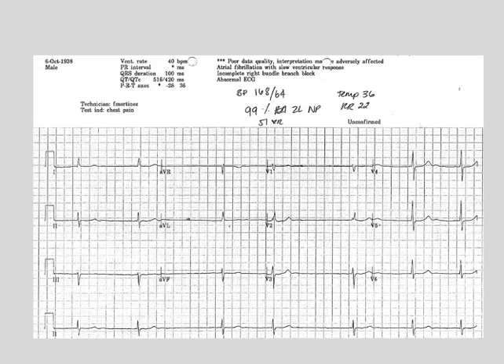Let's look at this ECG. What do we find here? Well, first, remember we should always exclude in every ECG certain considerations such as atrial fibrillation, atrial flutter, is it in tachycardia of some sort, is it a VT, is it an SVT? And whenever I look at these, of course, they're the sort of things that are at the back of my mind I always look for or exclude.